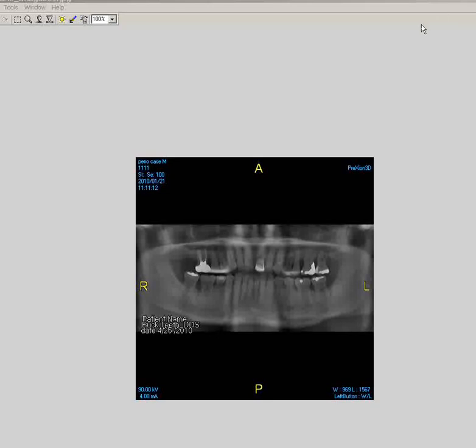It's called Snap-a-Shot. All you do is you simply take this frame and put it around the borders that you wish to keep. And just take the outer edges. You've got the double arrow. Drag it across. You're kind of framing it, if you will. See? And we'll take the other edge. You just kind of frame what we want to keep. Here, of course, we don't want to keep the top edge, so we're going to take this down and go right to the top of the panel image itself, and we're going to go all the way down.